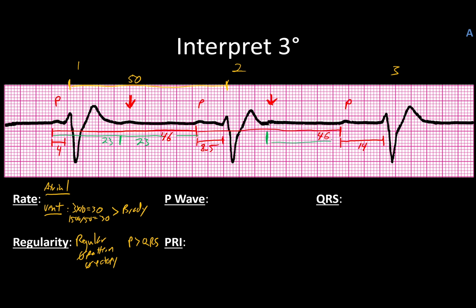So those imaginary little bumps are actually really subtle P waves, especially when you consider how small these other ones are that you can see really well. At that point, you've got a 2-to-1 block now, that you've got 2 P waves for every QRS, but because everything's so slow, and the fact your PRIs are getting longer despite the fact that you've had a dropped P wave or a dropped QRS, is what shifts us into this 3rd-degree block thinking.